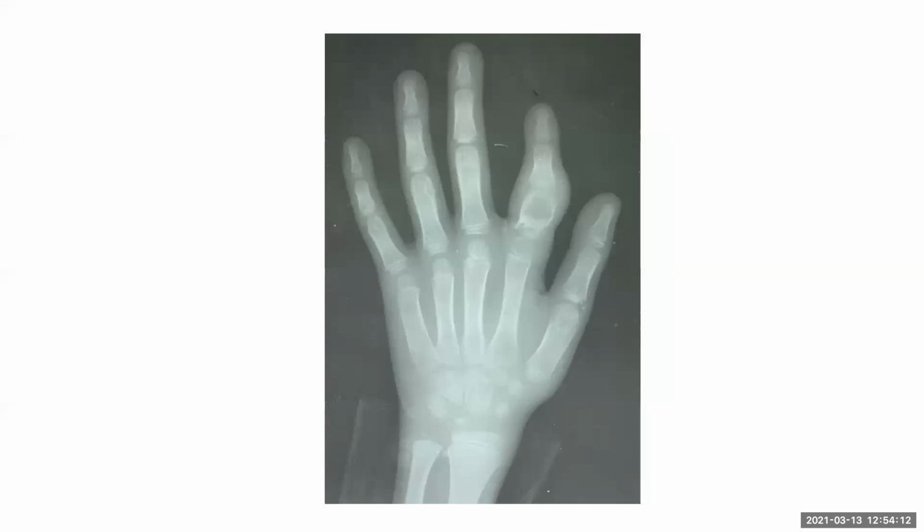So I have been provided with a radiograph of the hand. I can appreciate that the patient presented with a history of painful right hand. There is a lytic lesion which is occupying the proximal shaft of the index finger, and I can appreciate that it is associated with significant surrounding soft tissue swelling as well.